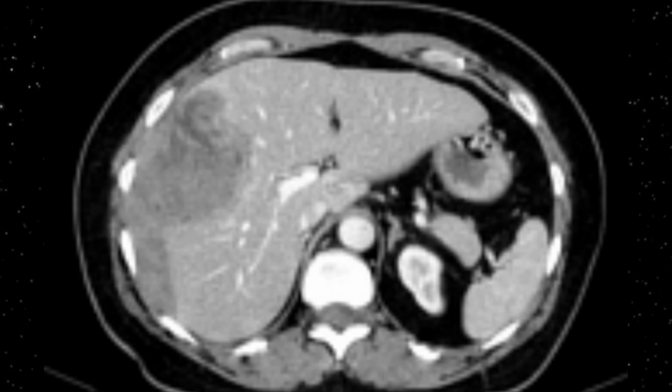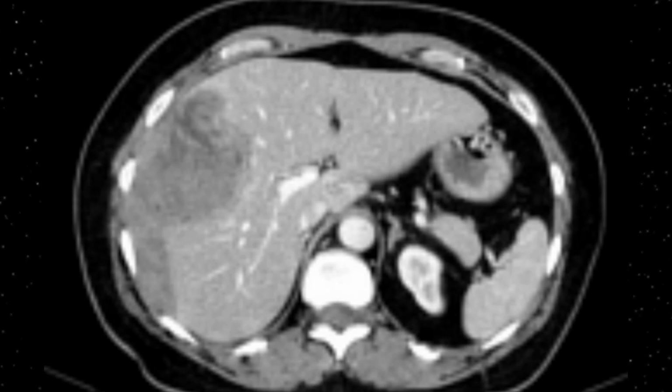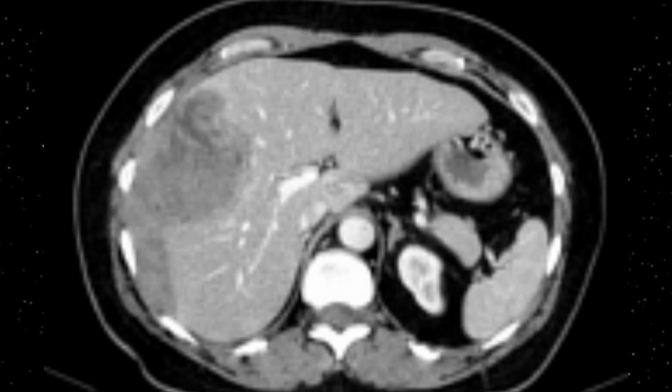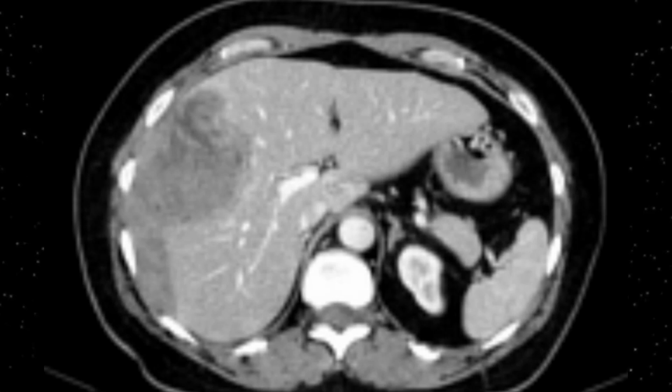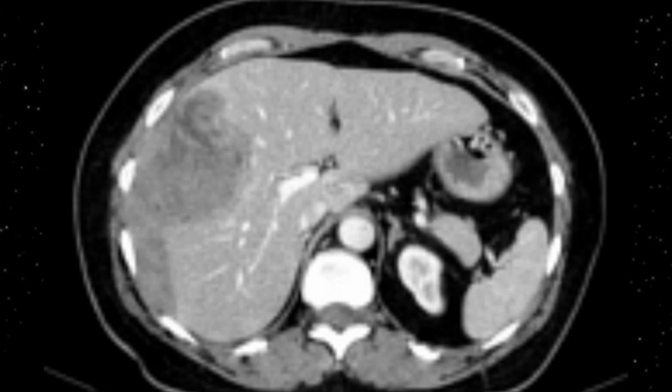This is a CT axial image. It shows the liver within the view and also bony structures. The liver parenchyma is normal, but a well-defined hypodense lesion is sitting in the right lobe, along the peripheral margins and the capsular region. This is the appearance of a hepatic adenoma on the CT scan.